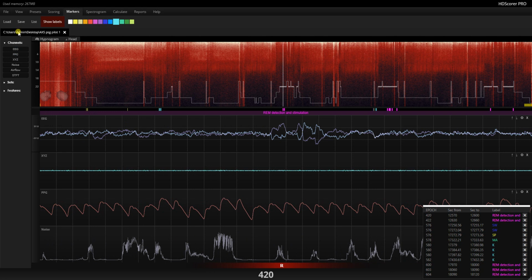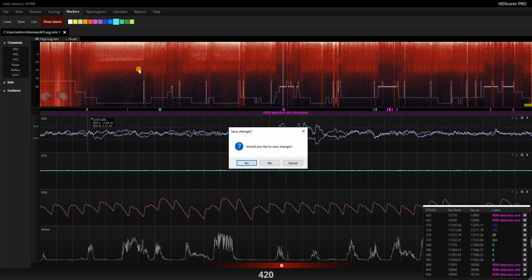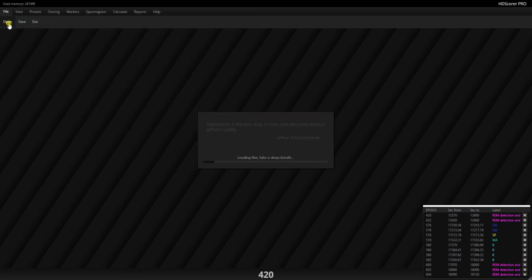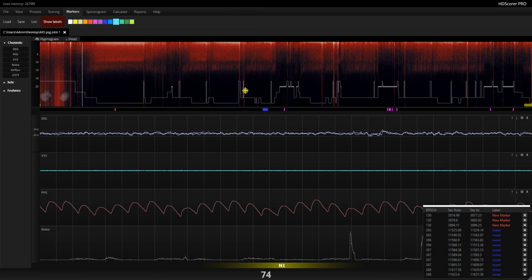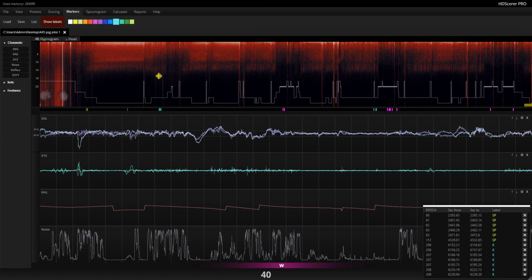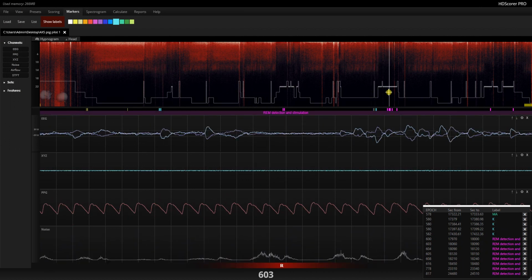So anyway, that functionality is there, and then if you save it, it will save a marker file. And then we try to open it again just to verify that it works. Oops, file load. And then markers load again. Oops, that's not test, that's another one. New, that's what I called it. Okay, so we're back here at our markers. Everything is there.